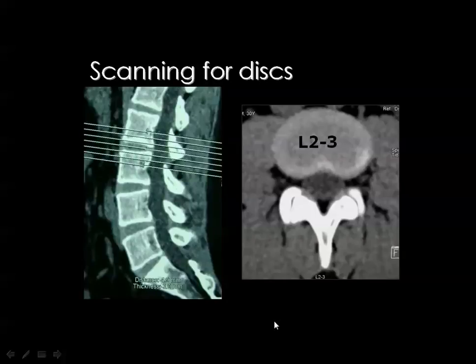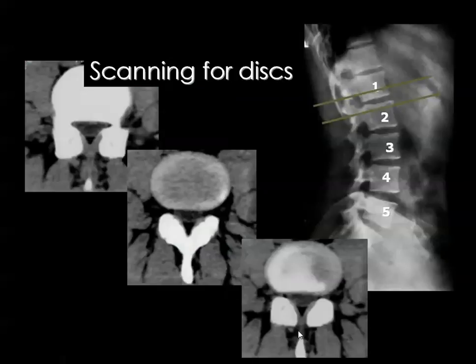Then you ask yourself, is the disc soft tissue or bone? You know that the disc is a soft tissue structure. Then you will evaluate the disc in the soft tissue window images. And also you should go to the section which has passed through the disc substance itself. Like in this example, you can see that there are three sections, and you want to select one for evaluation of the disc, and you should know where the disc is.